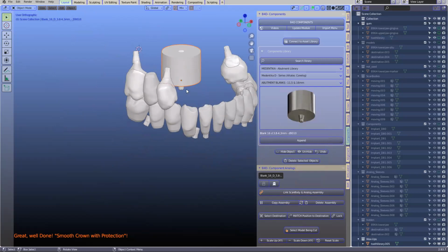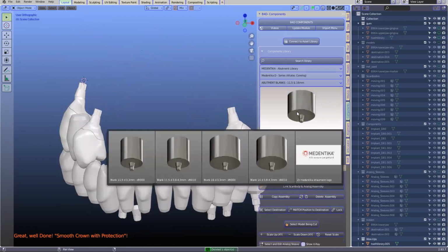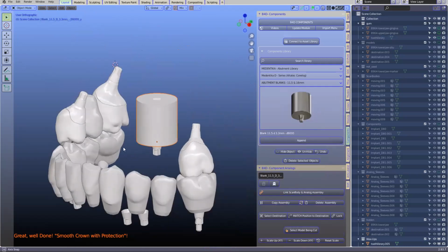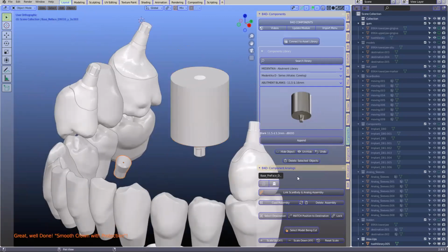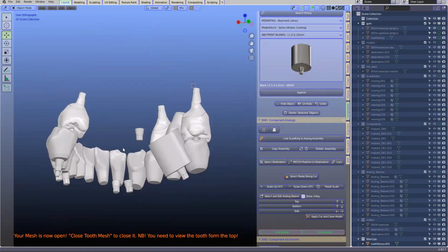So, wow, this one is massive. Gee, you got a big chunk there. What do you mill with that? Don't worry. I don't know. I think you've got enough space. Select destination, put this in there. So here we can see what that looks like.